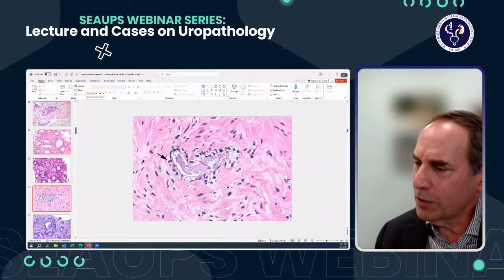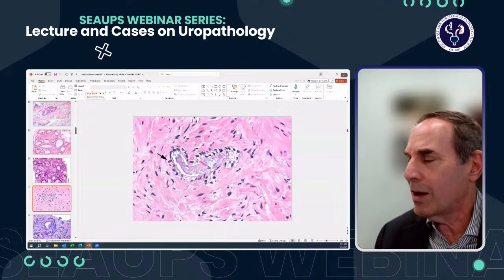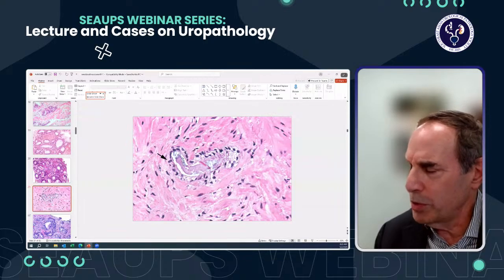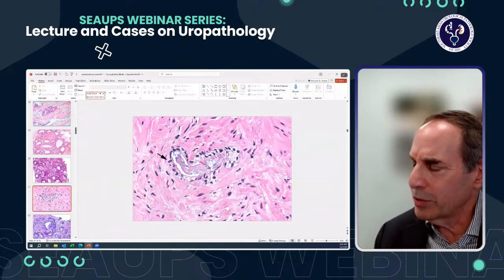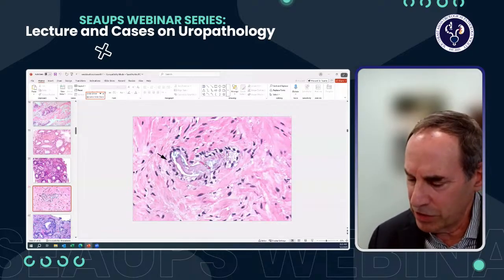So what you want to do is look for as many atypical features that I've just mentioned, and the more atypical features you have, the more confident you can be in diagnosing cancer in a limited focus. So here we see a gland with a mitotic figure, dense pink secretions, blue mucinous secretions, crystalloids. So again, the more features present, the more likely that this is cancer, not benign.